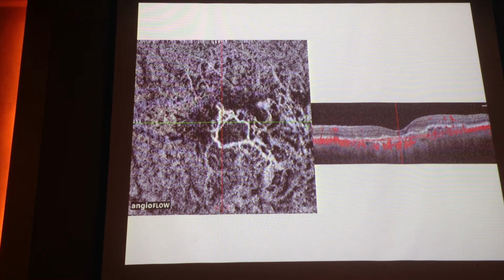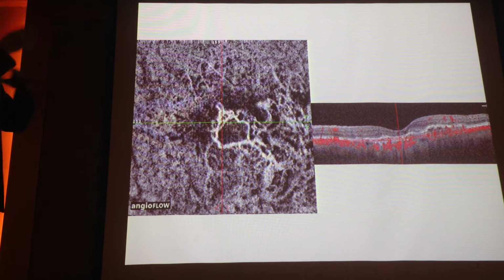Giovanni, I always thought that when you think of chronic, the level of arborization is more standardized, as opposed to a more randomized newer CNV. Yes. But remember that also the location, if it's under the RPE, is more regular and standardized than when it's breaching the neurosensory retina.